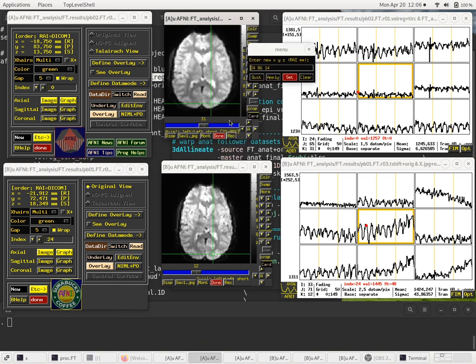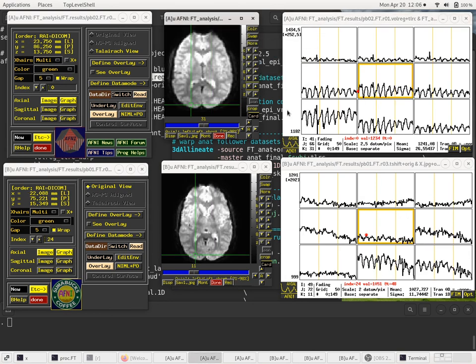I'll just jump back. It is a little cleaner because this voxel's time series is averaged from the 8 neighbors in original space. So there should be some noise cancellation you would hope for, and the signal would overlap and the noise would cancel a bit, so you'd hope to get a slightly cleaner volume time series.